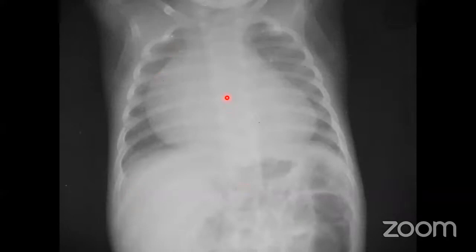Now you know how to see the cardiomegaly, but look, the cardiac contour has been maintained. So you must go for an echo, and echo will reveal there is pericardial effusion. So if the cardiac contour is maintained with a huge cardiomegaly, think of pericardial effusion, and this one will be narrow. The heart pedicle will be narrow.